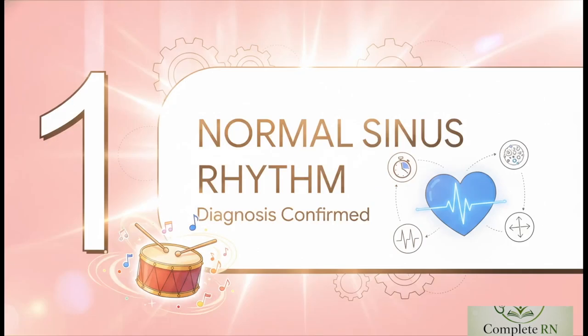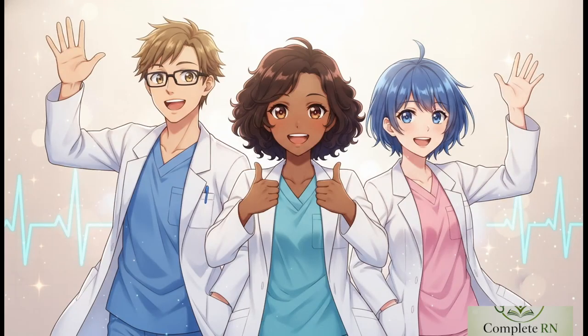Normal sinus rhythm. Interpretation confirmed. You didn't guess. You methodically solved it. You used a totally structured approach to verify the rate, rhythm, morphology, and intervals, proving without a doubt that this heart is doing exactly what it's supposed to do. Learning to read EKGs with this kind of unwavering clinical confidence is an absolute game changer for your practice. You've taken a massive step toward mastery today just by walking through this explainer with us.